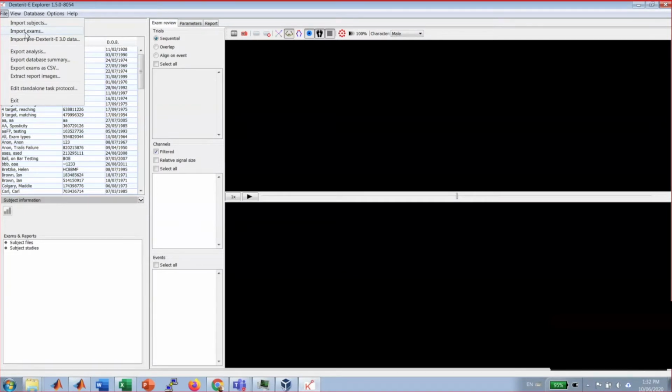But just be aware, this is free, so definitely go and download it, run it on your Mac, run it on your PC, and don't be afraid to give us any feedback for new ideas.